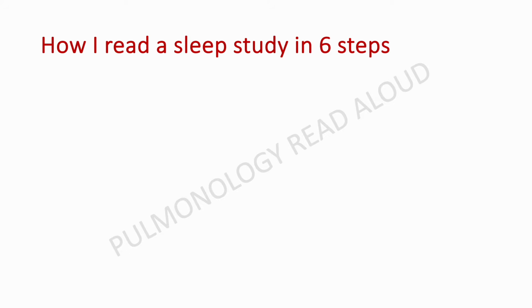So let me give you a brief review of how I read a sleep study, and that is in very easy 6 steps. First of all, when you receive a sleep study report, you have to look at the study quality and whether the patient has slept for enough time for you to actually report that study.